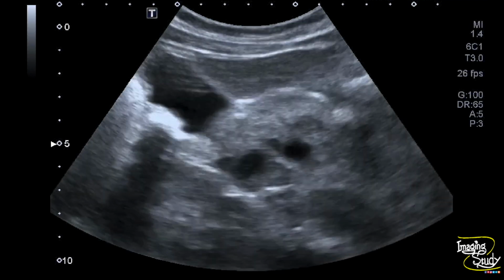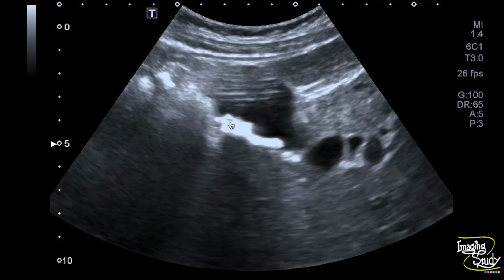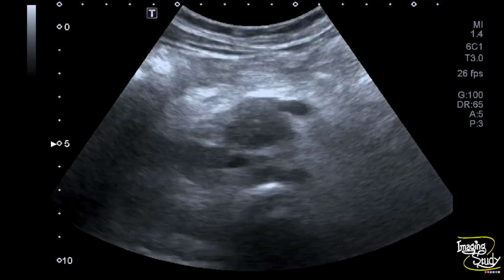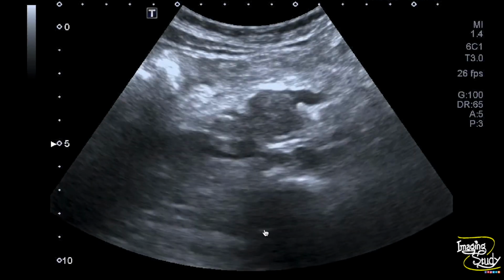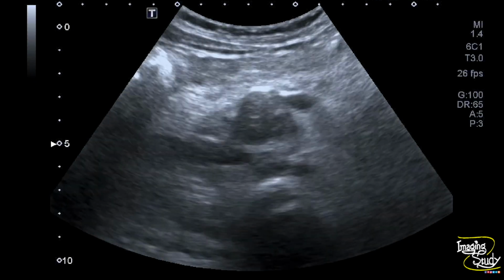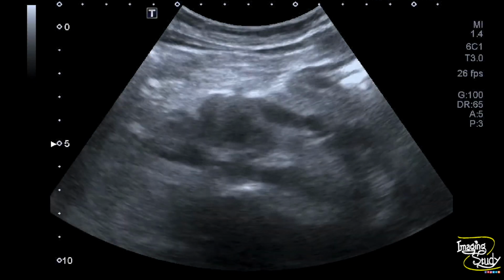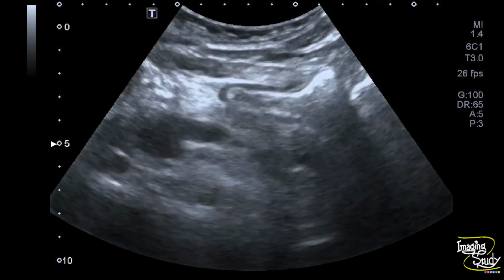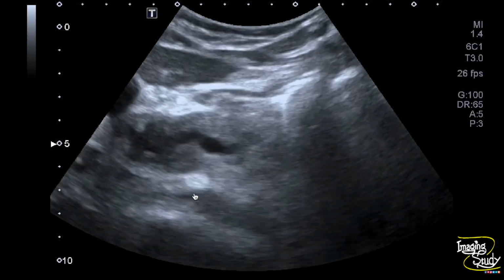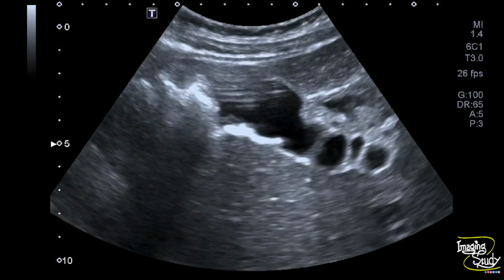If you look at the gallbladder, you can see hyperechogenic thick area casting posterior acoustic shadow which might be thick sludge or calculi as the patient was in NPO state with broad spectrum antibiotic. There are foci of calcification at the head region indicating it as a case of recurrent pancreatitis or acute on chronic pancreatitis.